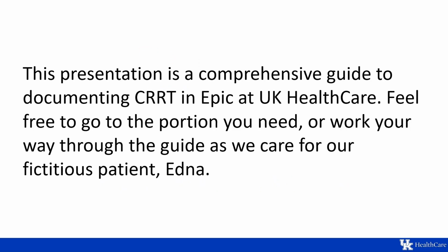This presentation is intended to be a comprehensive guide for charting essentially the worst day of CRRT you could possibly have on a fictitious patient. We'll try to go through pretty much every case that you could possibly have from start to finish, and we'll go over some frequently asked questions at the end.